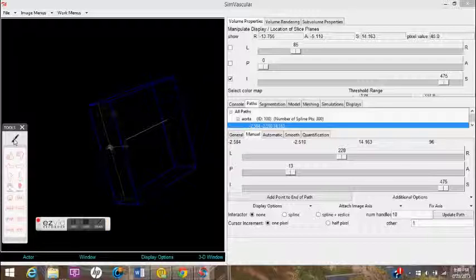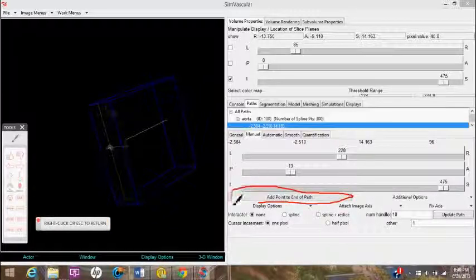And so I created a point. In order to add a point, you're going to want to put your cursor in the middle of the screen on that white dot and click the T button on your keyboard, and then you get, as I'm pointing to with that arrow there, those points.